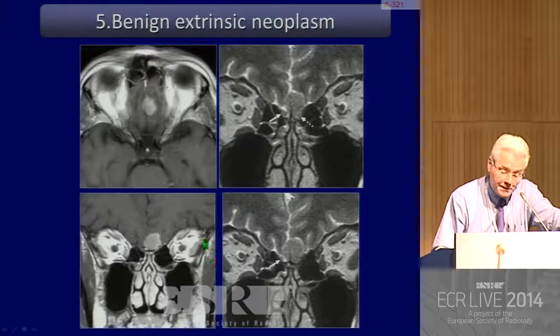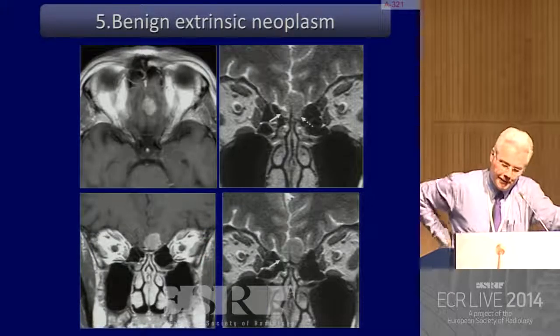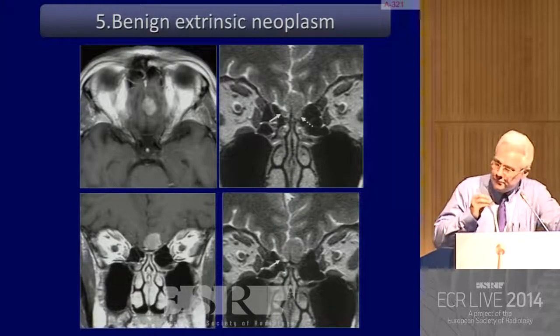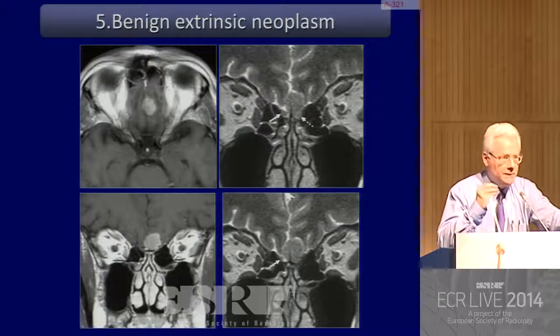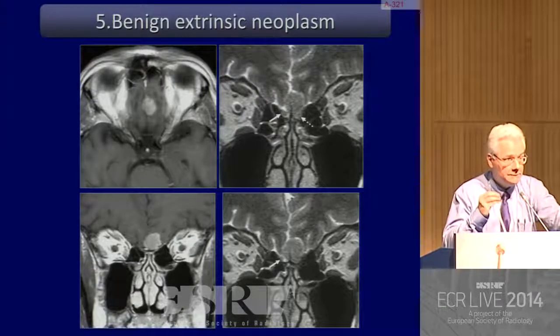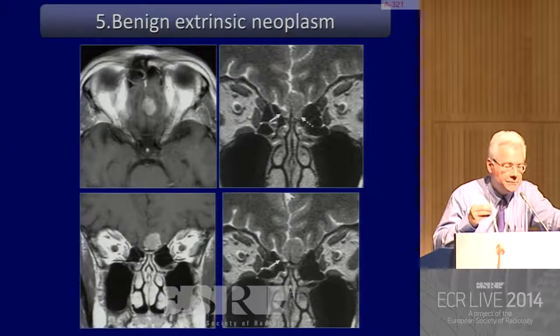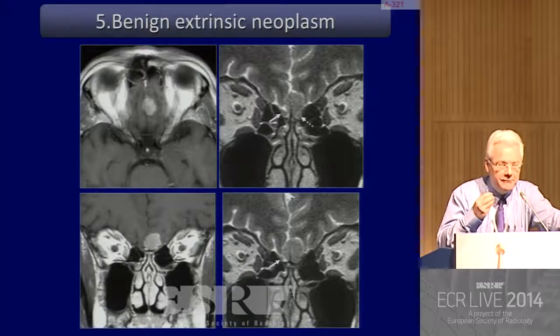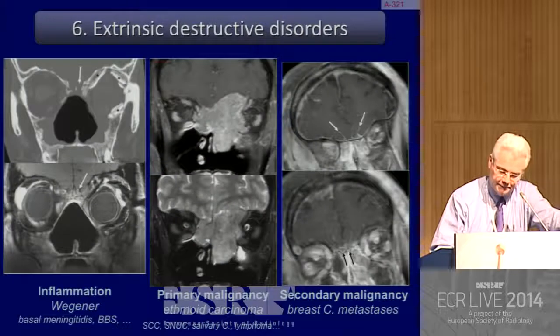And this is very interesting because this patient, who was a fireman, I talked with him, had the only complaint of monolateral left-sided loss of smell. This was a clinical confirmation that projection of olfactory information is ipsilateral and monolateral.